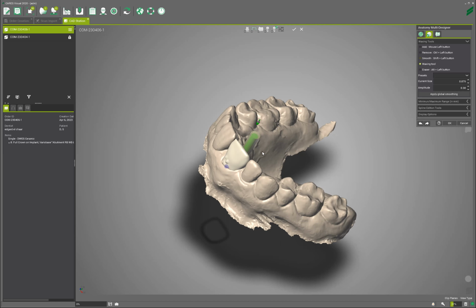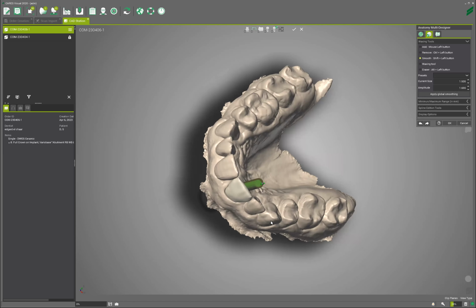Now I'm going to smooth all of this, okay, without creating a problem.